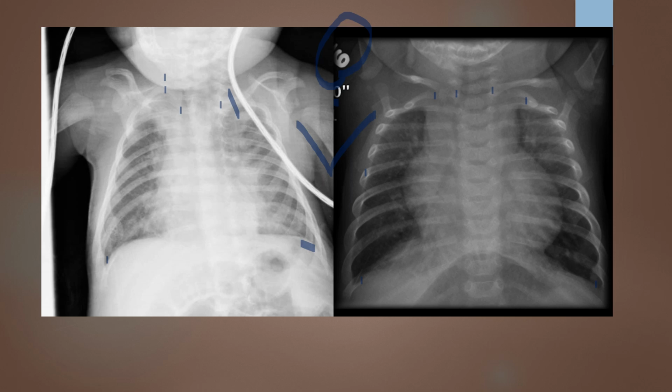If I look at mid-coronal tilt, I'm looking for the anterior ribs to be superior to the posterior ribs in the superior aspect, and that is what I'm seeing. Here I see anterior rib, and I kind of lose my posterior rib. Oh, here I can see anterior rib and then posterior there.